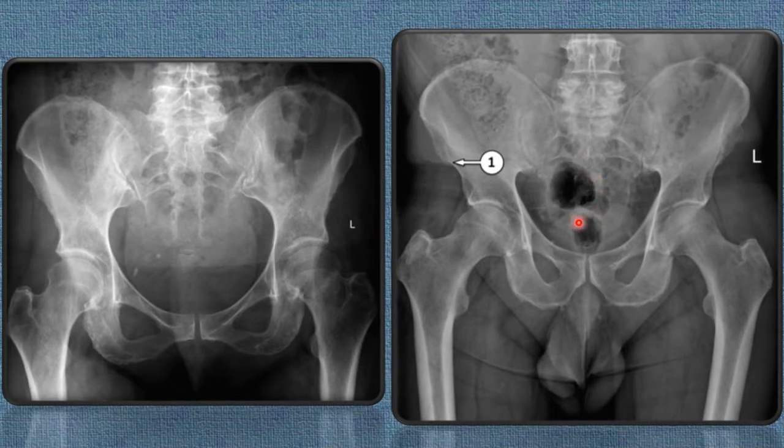Now these black spots, again I already told you, these are everywhere you can see, so there's nothing wrong with the bone, but it's actually air within the intestine. Again we can see the ilium, iliosacral joint, fourth lumbar vertebra, fifth lumbar vertebra, first sacral, second sacral, third sacral, fourth, fifth. This is the coccyx, this small one, and this is the pelvic brim or pelvic inlet formed by the ilium and pubis bone.